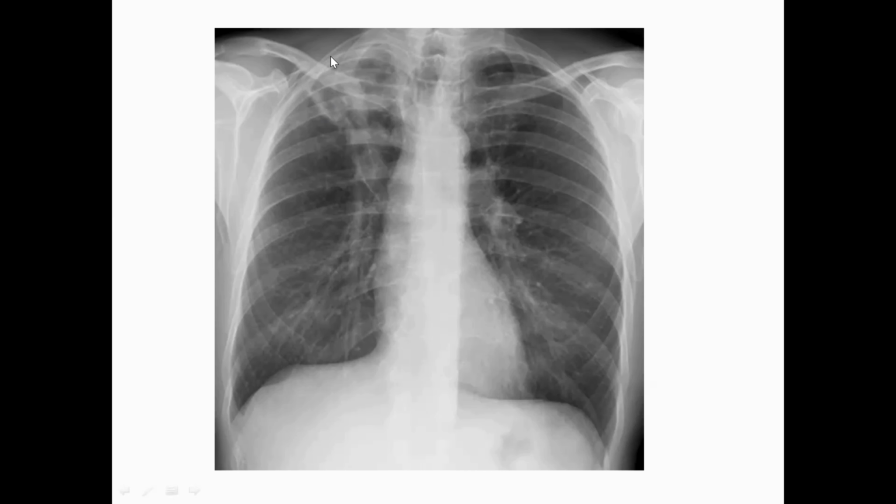So how are you going to describe this chest X-ray? We say there's a heterogeneous opacity or consolidation. So it's hetero, non-homo. Homo, what does that mean? If it's just like this, it is homo. Hetero means mixed between low and high density. So it's a heterogeneous opacity involving the right apical zone, and there is even a small cavitatory lesion inside it. You see this small cavity, yeah. So what does that mean? If there's a cavity within the opacity, it means that it's a reactivation.